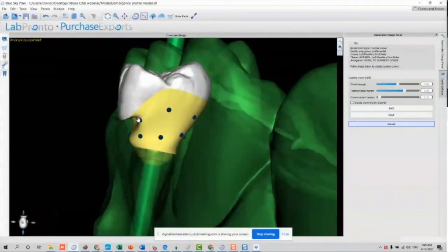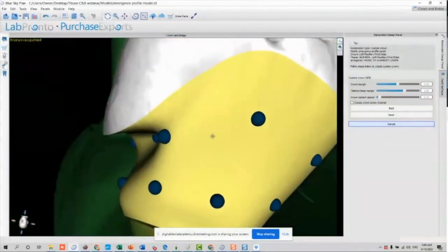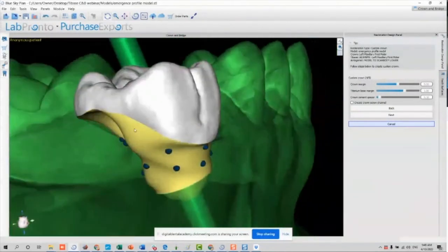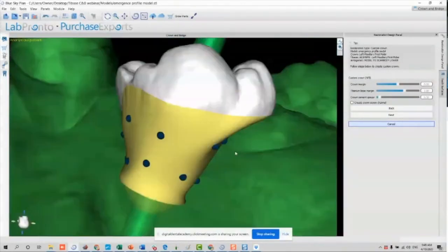You don't want any retentive areas when you're planning your restorations, and the reason is because you want nothing to be impinging or to be a food trap when you're doing your restorations. Okay, that's why it's all the shapes that we're talking about. So remember, avoid these shapes, avoid flat surfaces as well, please.